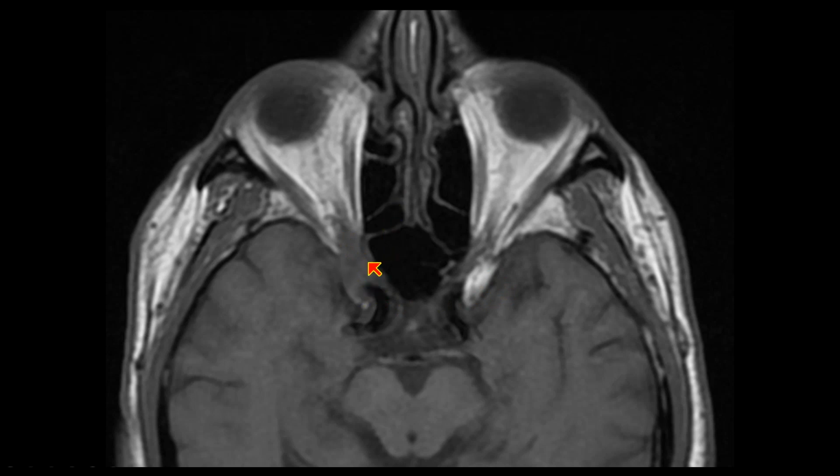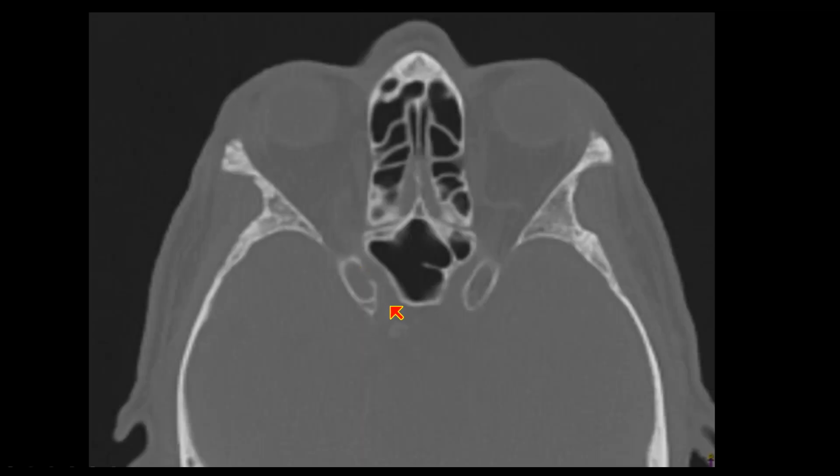And these surgeons had gone from the sphenoid sinus into that orbital apex. We want to remember that the CT scanner is in some ways just a big, stupid densometer. It's looking at densities of tissues all the time. And having marrow fat is very different than having infectious inflammatory tissue at that orbital apex right here next to the optic nerve canal.